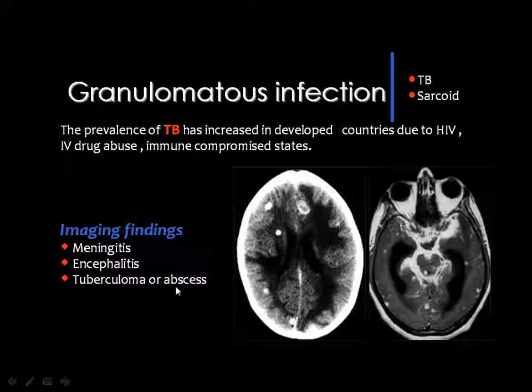The meningitis is similar to any other form of meningitis. There is diffuse leptomeningeal thickening and enhancement of the basal cisterns, as you can see around the ventricle, and you see here and there. In order to specifically diagnose this as tuberculous meningitis, you should see some tuberculomas inside the brain parenchyma. Then you know that this is tuberculous in etiology.